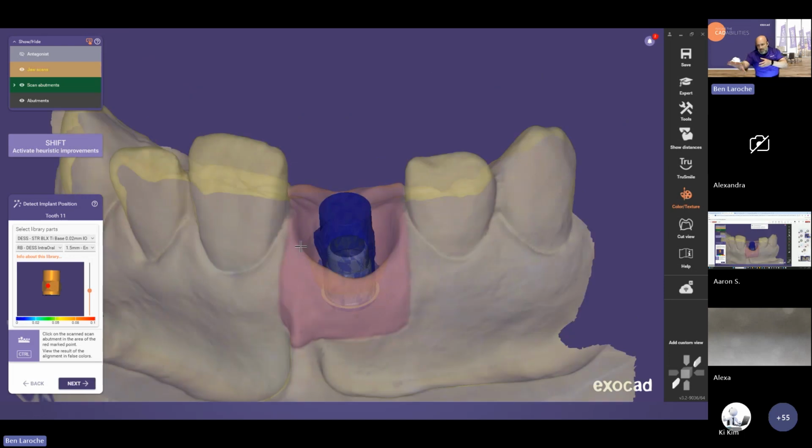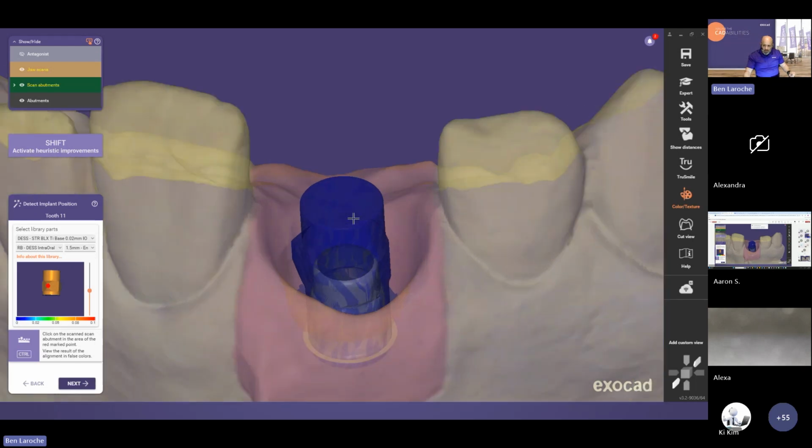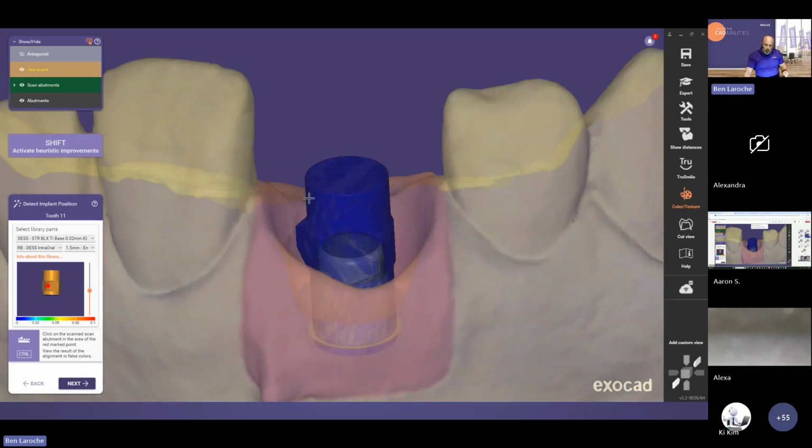Now, obviously this is a perfect setup, so an ideal situation. So you can see I have 0 differences. It is a demo case. On a real live case, you're probably going to see discrepancies around the corners, wherever there's a sharp angle. And the reason for that is not a fault of any kind other than just different technologies. So this right here, I hope everybody can see my cursor, this right here is a 3D drawn geometry. It's actually drawn in a software, so a 90-degree angle will be a perfect 90-degree angle, no rounding, no anything.